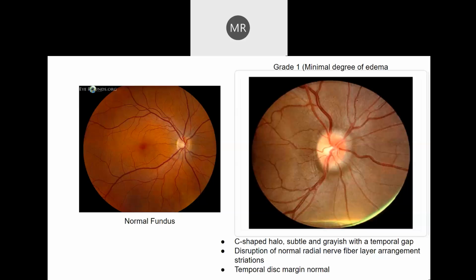The optic disc is usually pinkish with the cup whiter compared to the disc, and at the center there is a darker section, which is the macula and the fovea. You can see the vessels as well, where the veins are darker compared to the arteries. So that's the normal fundus.